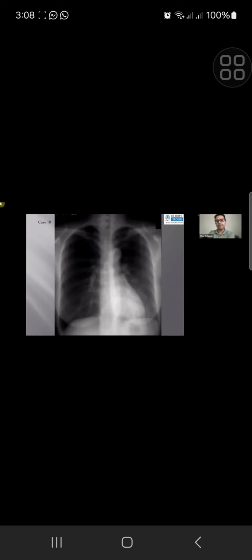Okay, next case. I am presented with a frontal radiograph of the chest. Immediately looking at the images, I cannot appreciate any obvious abnormality, so I will look at my review areas. It is really tricky to detect on X-rays. I'll just show you the CT straight.